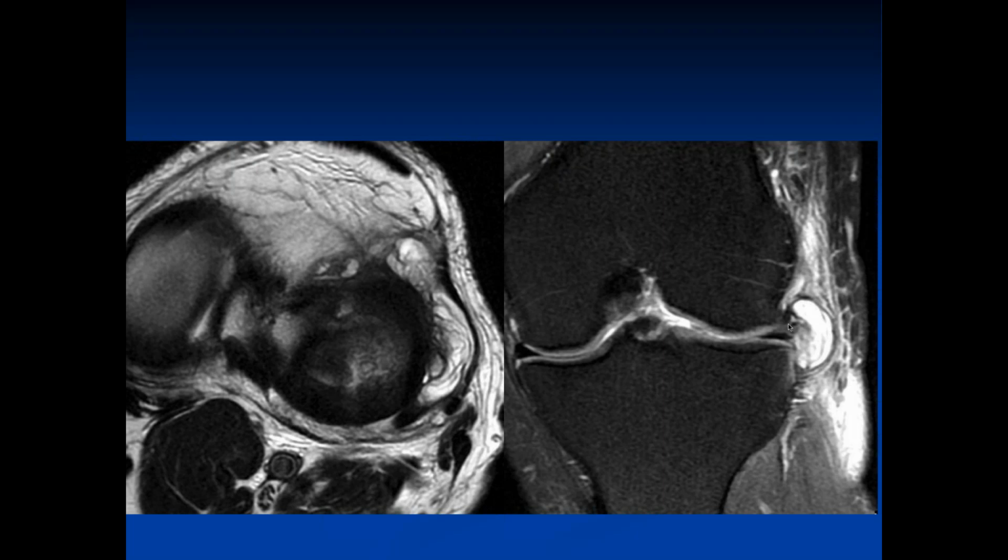Okay, good. Yeah, so these are para-meniscal cysts. When you have increased pressure in the joint space from weight bearing, it forces the fluid out through the tear into the periphery, and then the meniscus acts as kind of a check valve. It doesn't allow the fluid to flow back in again. So these can grow to become quite large because of that mechanism. And some people believe that if you do the arthroscopy and do a partial meniscectomy, it opens this up so it no longer acts as a one-way valve, and therefore they tend to stop growing and become smaller, and they tend to become less symptomatic. But I still think that there's a lot of debate as to the best way to treat these.